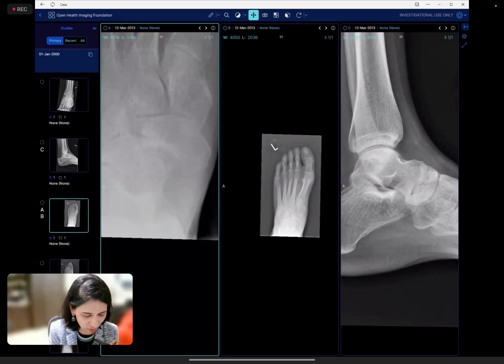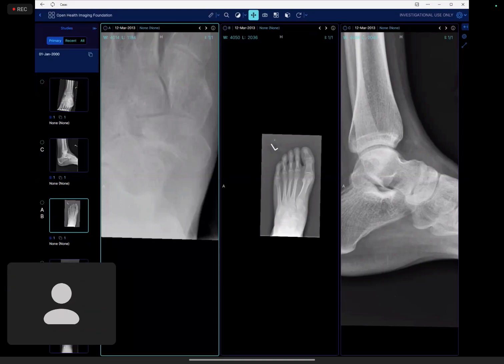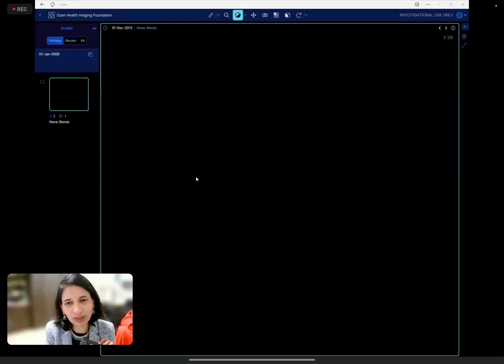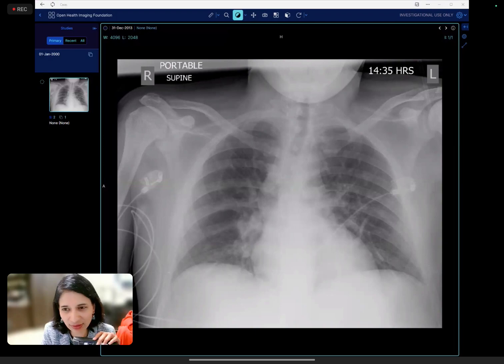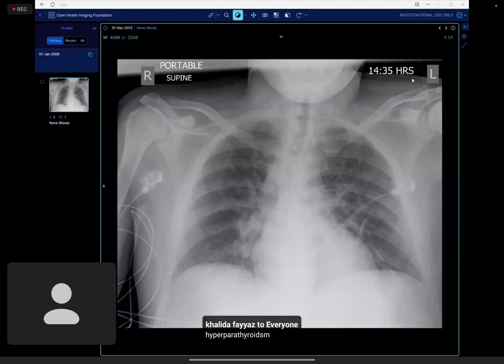So we'll go back to the young patient with the chest X-ray. Now, I know I don't like lists. I also don't like lists. But for 2A also, you should know what are the other causes of lateral end of the clavicle resorption. So rheumatoid arthritis you got.